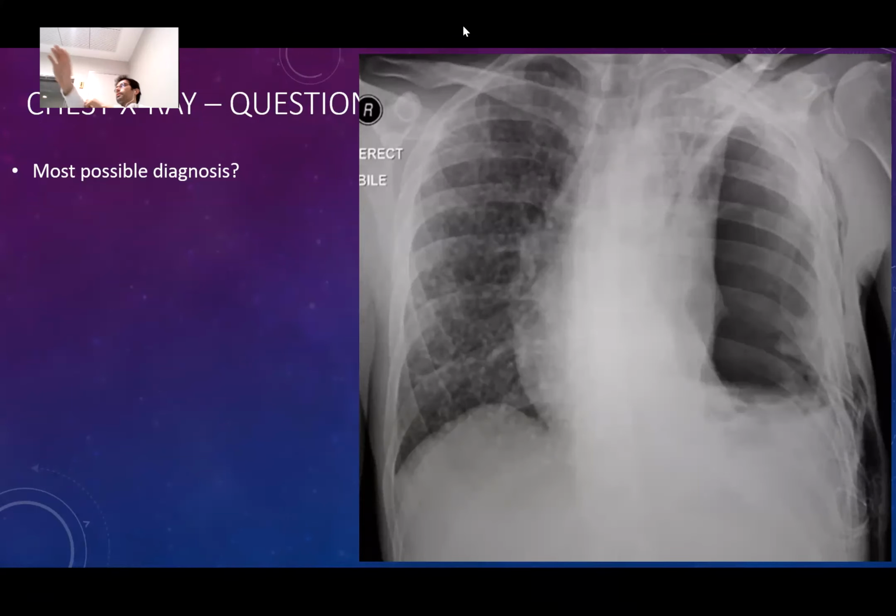Unfortunately, these are the cases we're going to discuss. It's all mixed together now. So when you're entering an exam, please start with a very quick technical evaluation. I'm looking at the clavicles. They are a little bit rotated to the left. And I can see the vertebral bodies. For inspiration, I'm counting ribs, 1, 2, 3, 4, 5, 6. It is enough. And I can see the apex of the lungs. In 10-15 seconds, I finished the technical evaluation. So I will go to the systematic approach now.